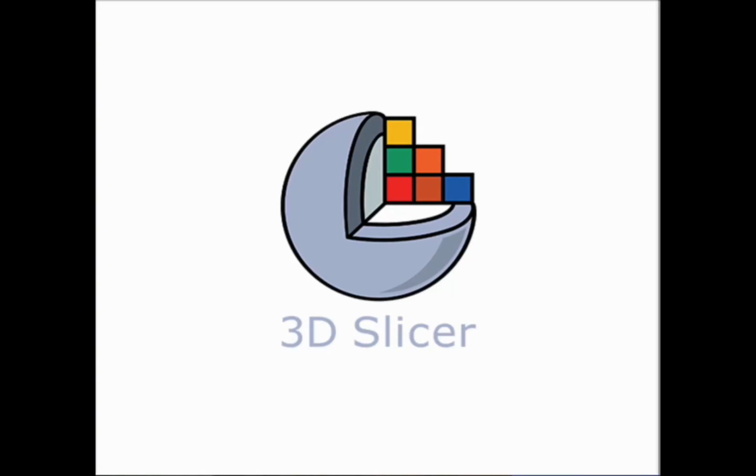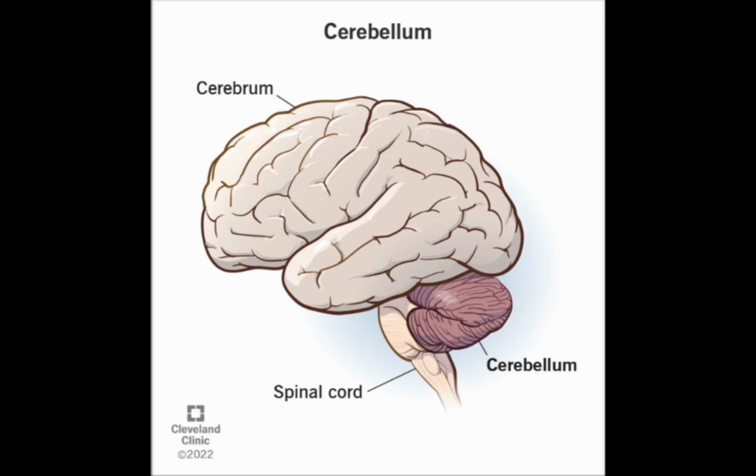In this episode, we're focusing on the cerebellum. First, we'll take a quick look at its anatomy and function, and then we'll move on to segmenting it in 3D Slicer. The cerebellum, or little brain, lies beneath the occipital lobes and behind the brainstem.